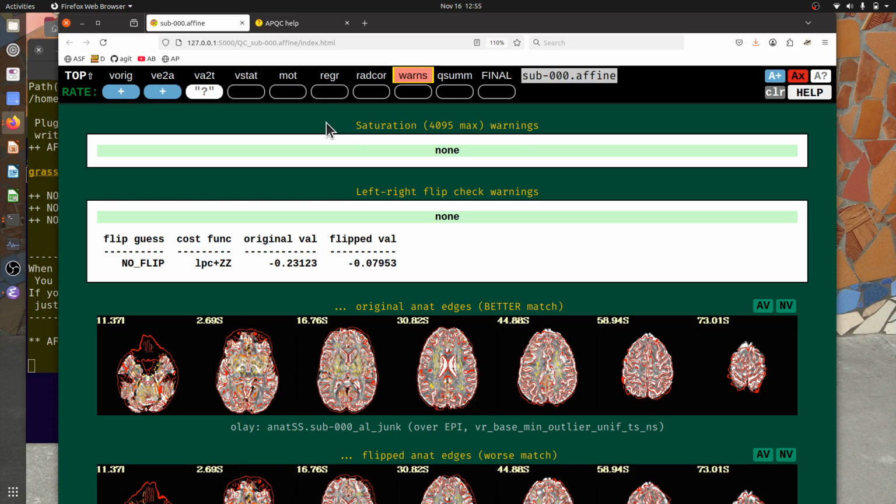And if that happens, the danger is that the signal is actually going up higher than the numbers can record accurately. So that kind of saturation, in this case, means that you've reached a particular power of 2 minus 1, and so we can check for that.